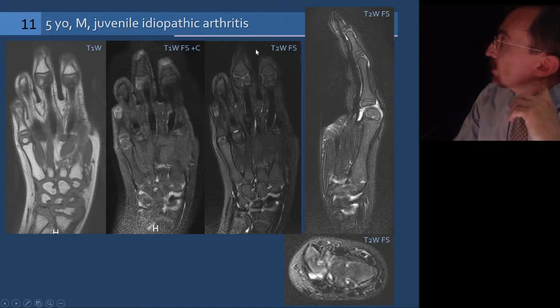So in this patient, apparently there are these erosions, but once again, this is another patient. Once again, you don't always need to see such conditions as joint synovitis or erosions. Sometimes you can only see tenosynovitis.